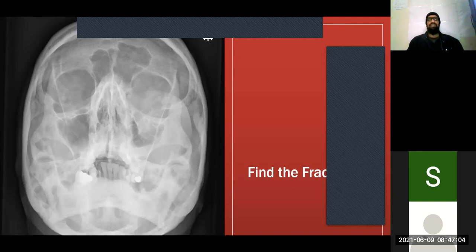Agreed. I put these here just to make you guys understand that while the simple lines will show you a lot, they may not show you everything. All right. So you have to sometimes do both. Now, let's look at the more complex lines. Let's go across here. And again, do we notice anything? Not really. Agreed. But there's something going on over here.